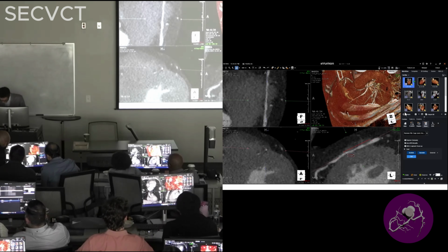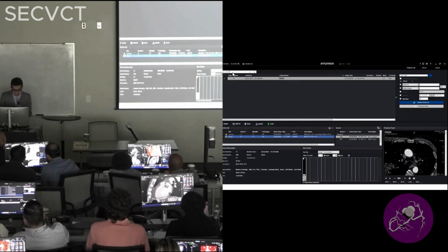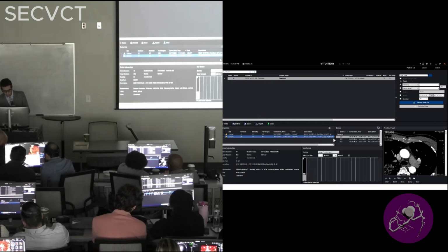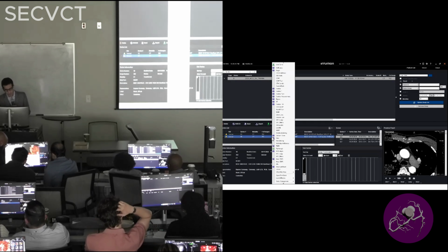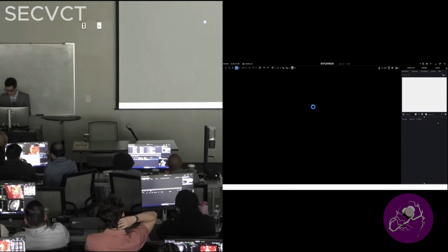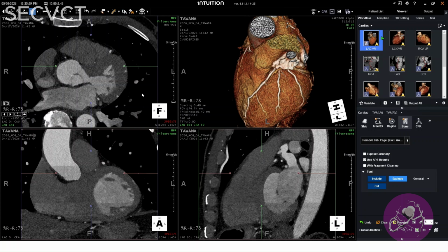Case 4, which is Tawana. So if you go to the patient list, MCG_DA, TAWA, and you're going to pick here the best diastolic. I don't think it matters, but let's just go together with the best diastolic phase. So right click, and you're going to show the cardiac. So I'll give you a minute to load the images.